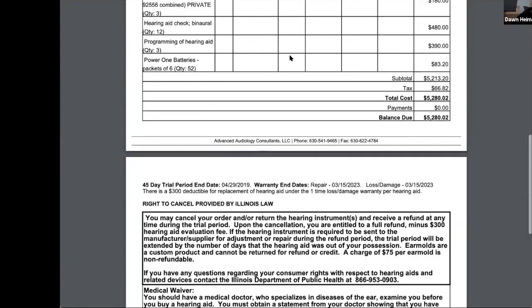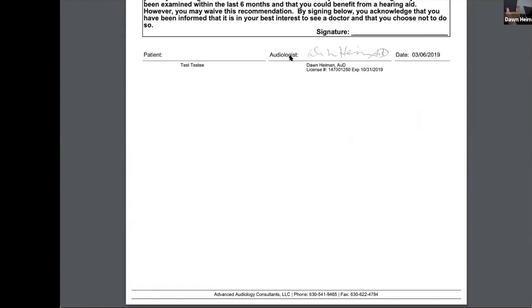Yep. So I say you get the original, which again instills even more trust. Right, yeah. Scan a copy in, you get the original. That goes into their folder. We have that patient journey. I showed you guys that, right? Where the day, this is a starting point.